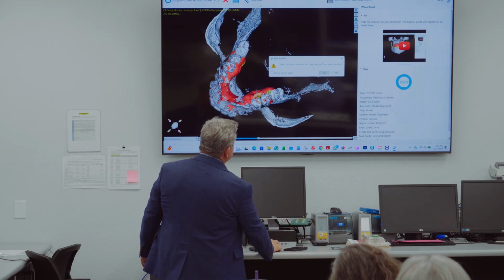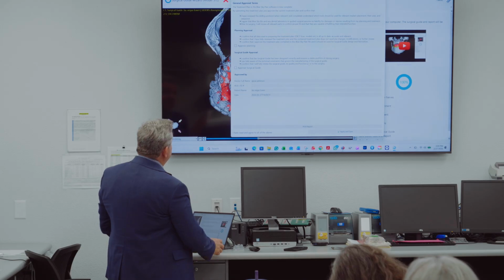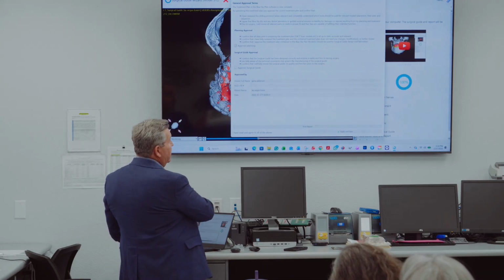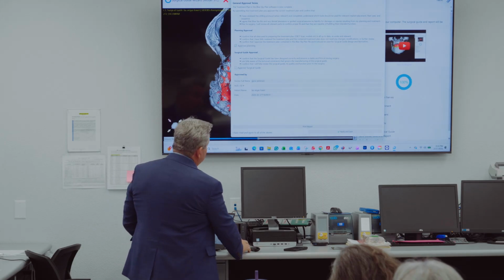So click yes, and it gives you all these liability statements. Basically, you think it's correct clinically. I'm approving the plan, and I'm approving the surgical guide. Okay? That way, Lab Pronto knows that you're good with it. They're just going to make it and send it to you.